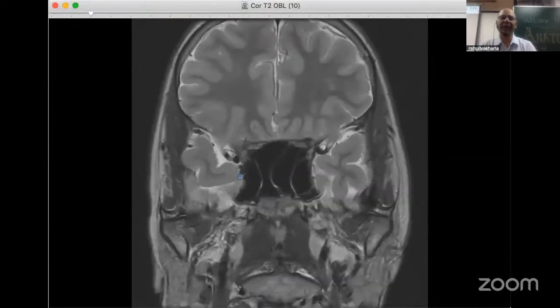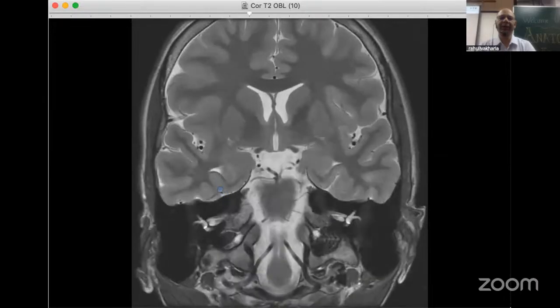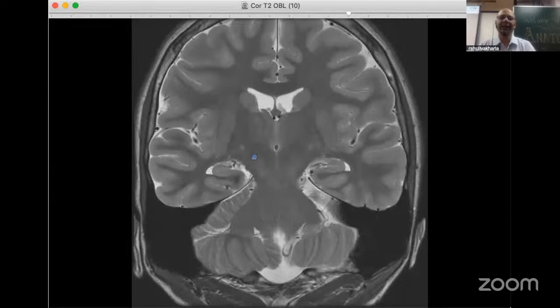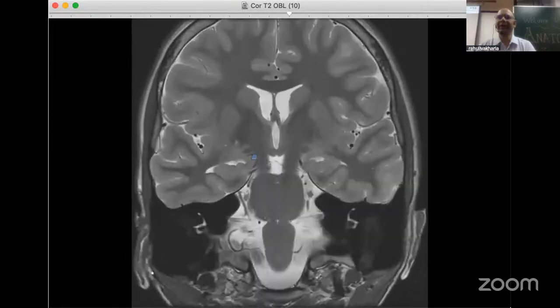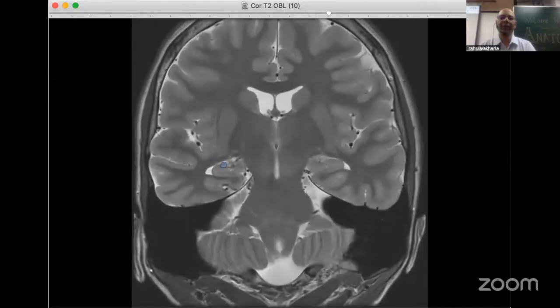So coming from anterior to posterior, if you can see this on MRI, the superior temporal gyrus, the middle and inferior temporal gyrus, and you can see the collateral sulcus out here, beautifully. This is the interdigitations of the hippocampus. This is the uncinate gyrus. Starting from anterior, this first would be the head, which is the most voluminous part. Coming to the body, we have started seeing the choroid plexus. So this would be the body.